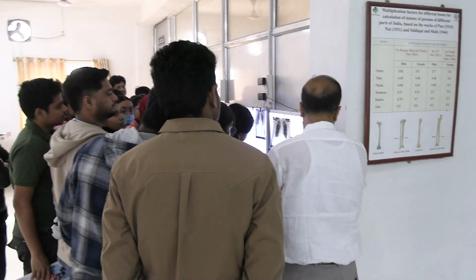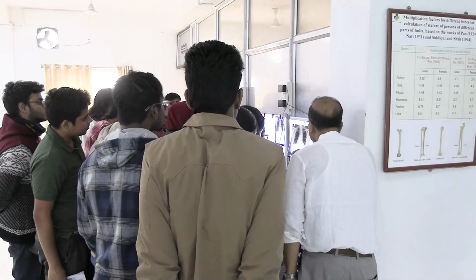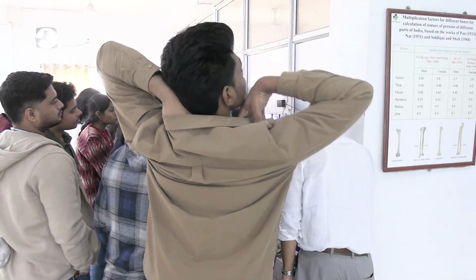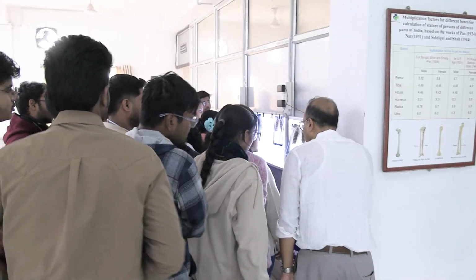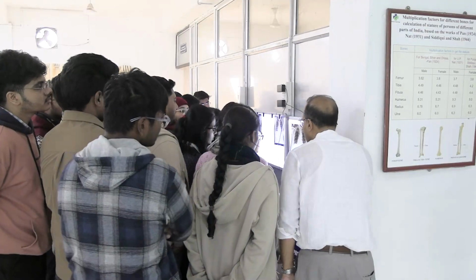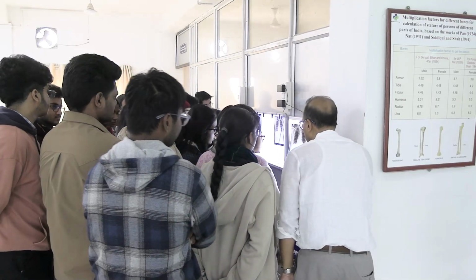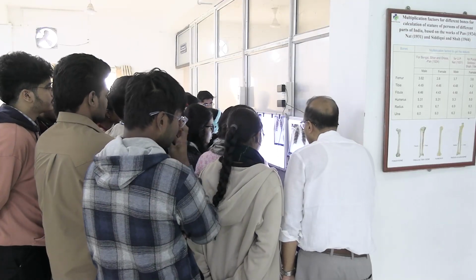These X-ray plates, whatever you have, these are all plain X-rays. That means nothing special you are looking at. So whenever you are reading one, note plain X-ray or special X-ray. Then the view, what kind of view you are looking at. Then the region, what you are seeing in the region. That means bony parts, joints, then soft tissue shadows, lung shadows and mediastinal shadows. Mediastinal shadows, cardiac borders, lungs, bronchovascular margins, CP and CM angles, apex and base, diaphragm.